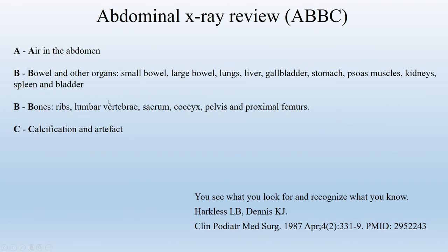After doing those things that we mentioned, it's time to begin assessing the abdominal X-ray. I do like this phrase here: you see what you look for and recognize what you know. I think that's a great motto for today's lecture, because if we know what we're looking for, it will help us to recognize it.